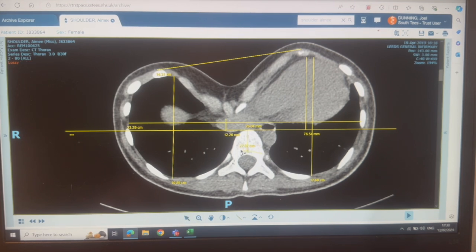And AP and lateral for the vertebral index and the depression index. And then measure the dip. So the dip's going to bone, so it doesn't have to be bone or cartilage, so it's going to go there. There's some cartilage, vertical. So while we're here, might as well do the torsion angle, which is huge for this lady. 42 to the right. So there's all our measurements done.